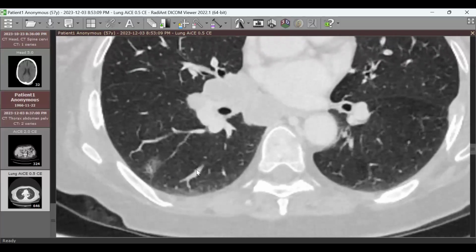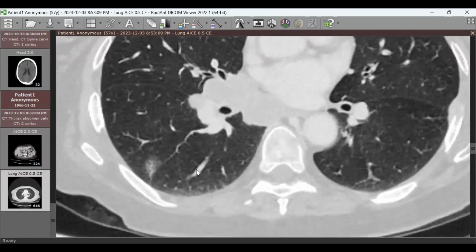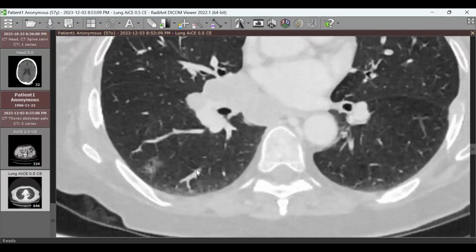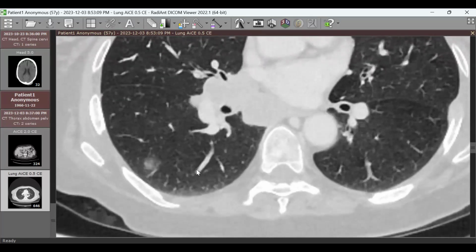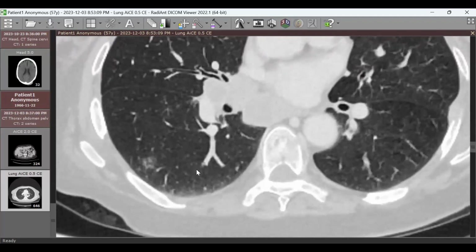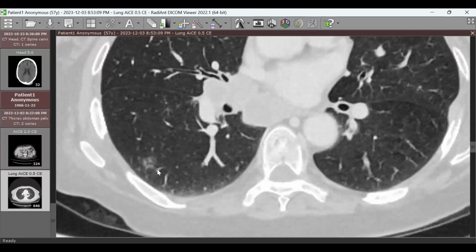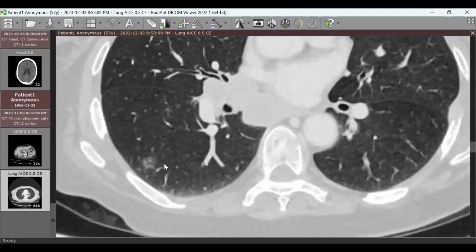So tell me the type of this nodule. Is it solid, part solid, or ground glass? It is ground glass. Is there any solid elements? Actually, you might think that the dense structures are vessels, but if you trace them, you can't find, especially this one here. If you trace that, it's not convincing as a vessel, right? And maybe there are a few others.